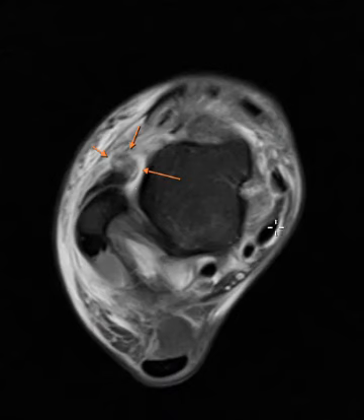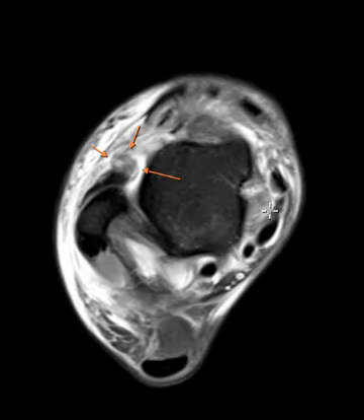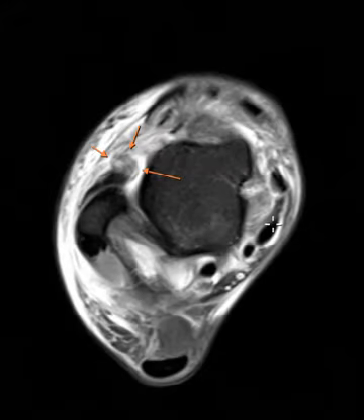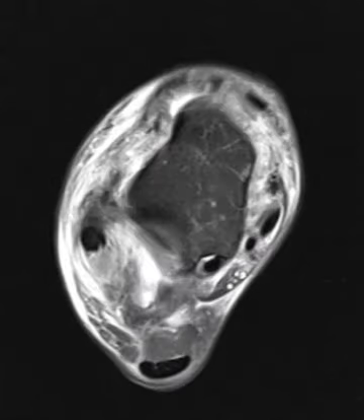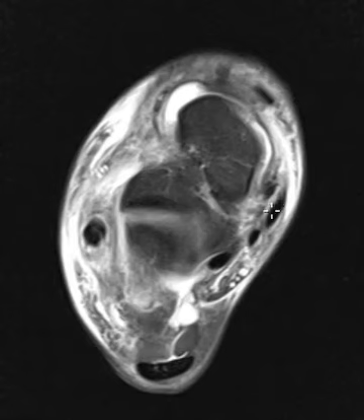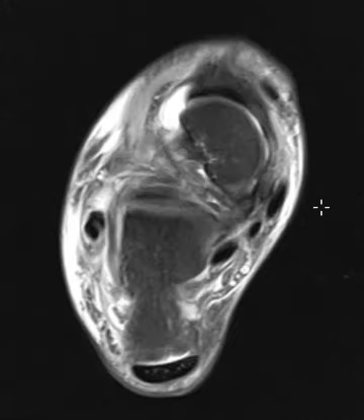Now the other thing is the posterior tibial tendon had an injury as well. It looks like it was torn from the navicular attachment. So this is the posterior tibial. We call it Tom, Dick, and Harry. So posterior tibial, flexor digitorum, flexor hallucis. As we come down, down, down, we'll see the posterior tibial tendon here. They all look nice and dark and uniform, homogeneous.